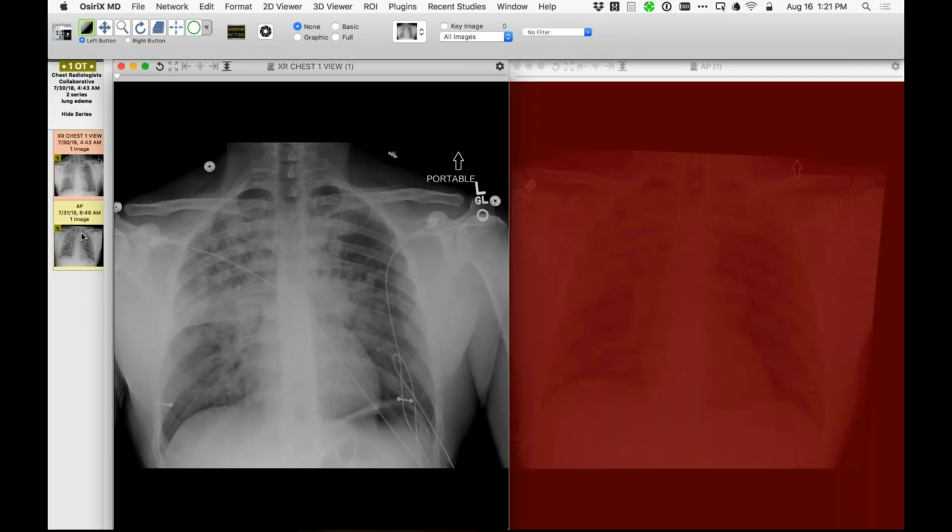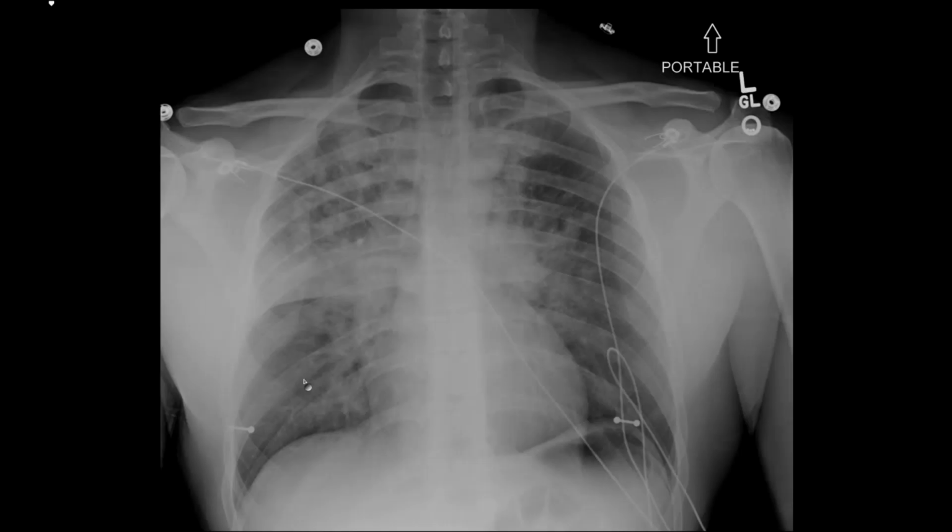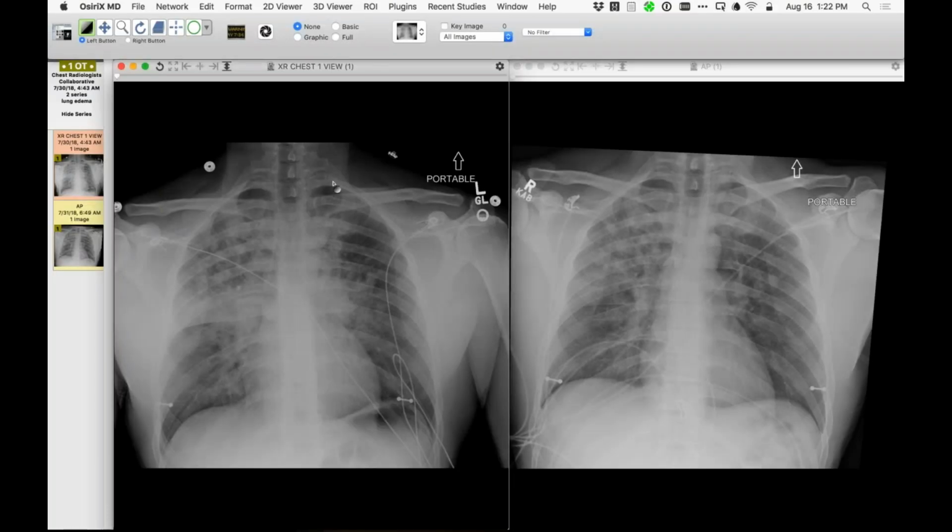And you'll see the next day he is getting better. He was discharged. So by virtue of the context and the appearance, high altitude pulmonary edema is our diagnosis. It's a strange pattern. I've seen various patterns of it. I have no idea why it's so focal, mostly in the right upper lobe, left perihilar, looks like consolidation. I think without context, of course, you wouldn't know what this is, but undoubtedly a case of high altitude pulmonary edema. Howard, how old is this man?